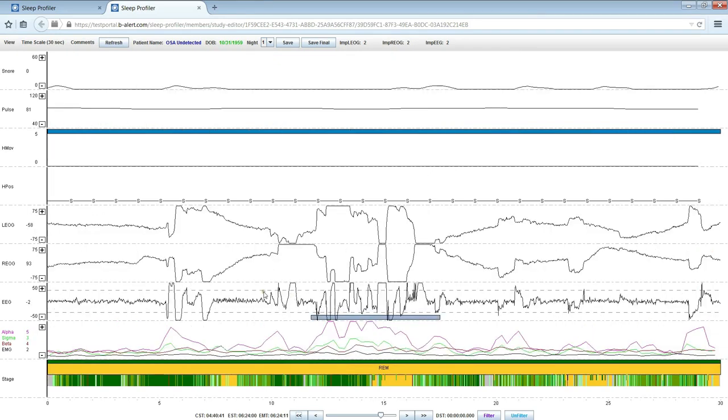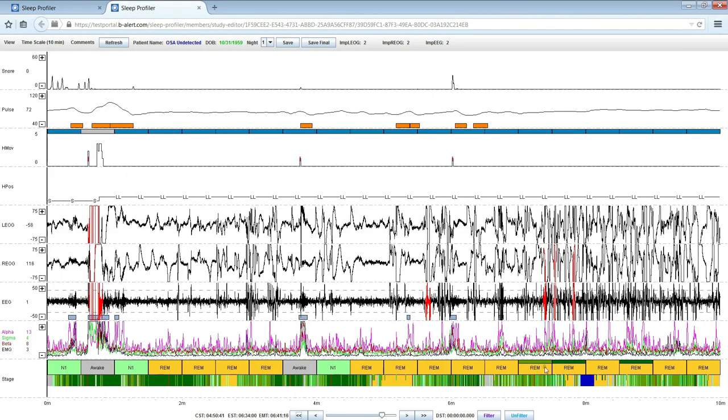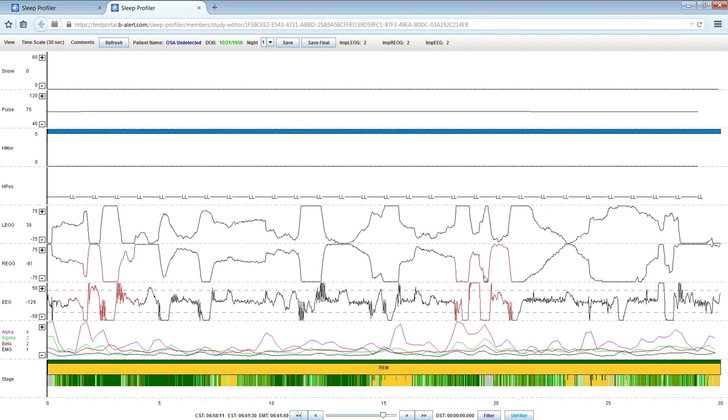It seems counterintuitive, but large amplitude phasic activity after decontamination can leave patterns that exceed the plus or minus 30 microvolt range and can get misconstrued as slow wave sleep. Pressing page down, here are a couple more patterns that will likely be high phasic activity. When the phasic activity is plus or minus 100 microvolts with sharp edges, it gets detected as artifact and is marked red. The balance is used for staging the epoch.